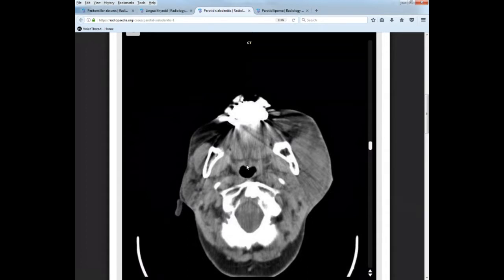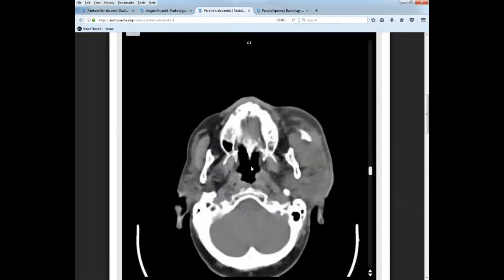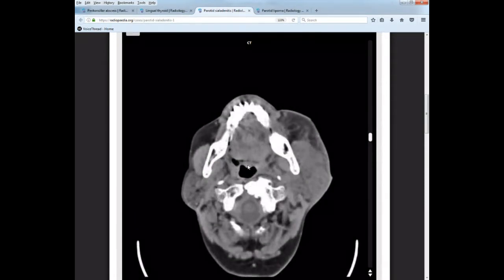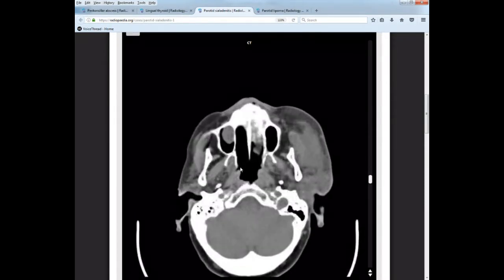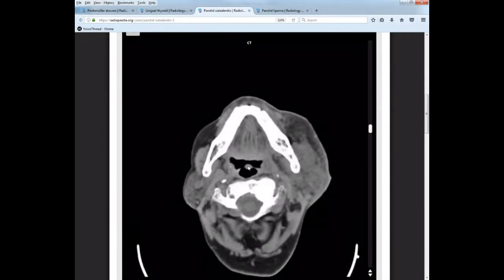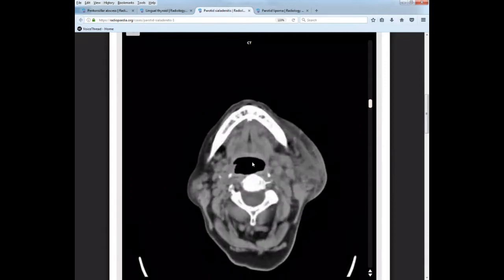Okay, so if we're at uvula here, we know that this is the start of the oropharynx. So everything above this is your nasopharynx down until we hit soft palate and uvula. Okay, so everything above this area, nasopharynx, we get to uvula. Everything below this area is now going to be oropharynx until I hit the hyoid bone. Okay, so uvula. So as we travel down, we're now into the back of the throat. This is the back, just behind the uvula.